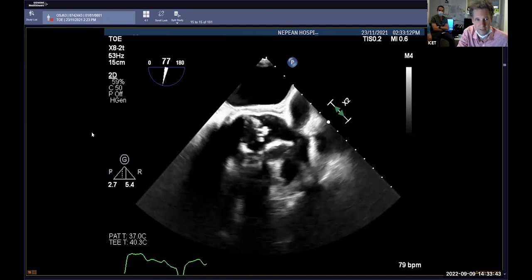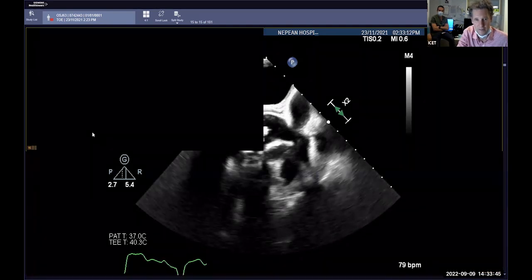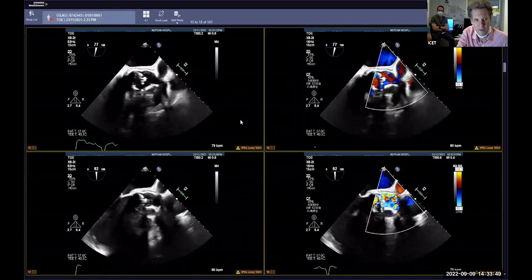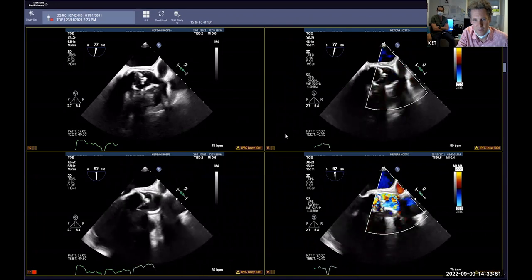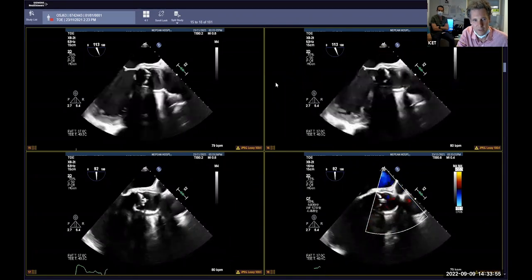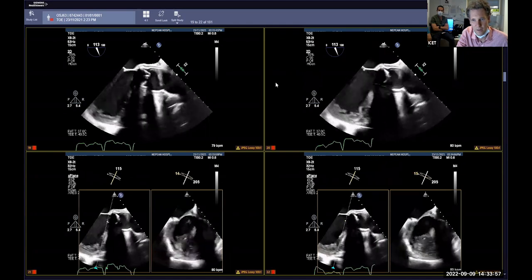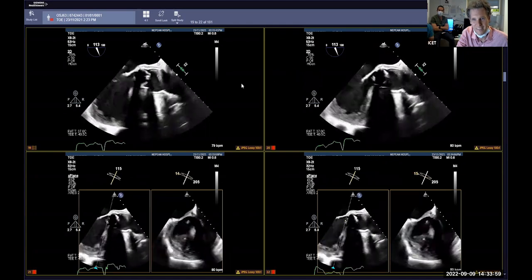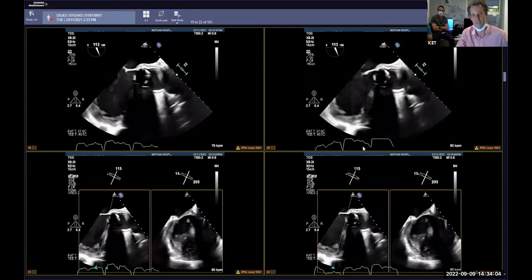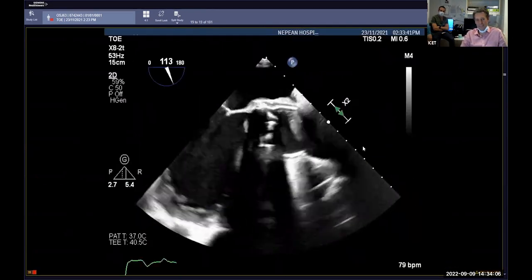Very nice. Yeah. System's a little slow. Here we go. This is what I'm saying. Just like Emma says, infection until proven otherwise, right? Talk to me through this.